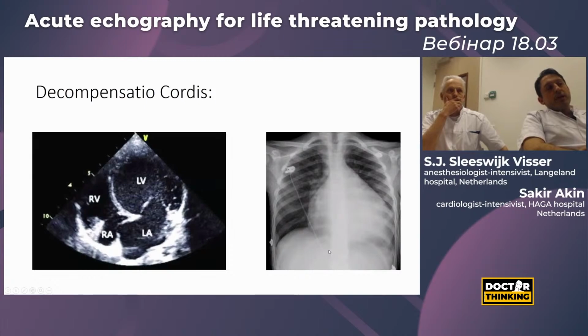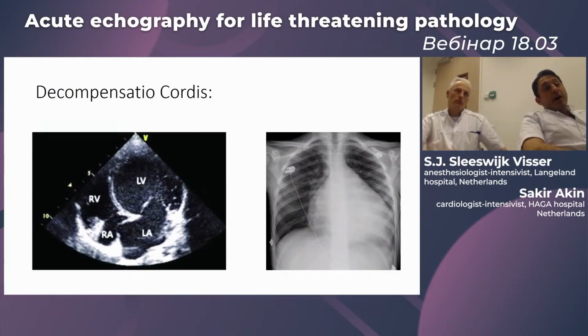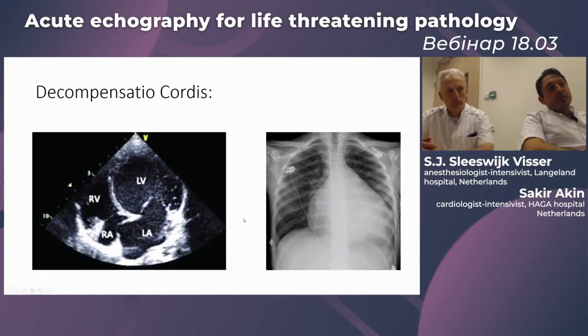And at the end, we also often have patients with acute or chronic failing left ventricle function. Those patients who are known with chronic heart failure can also present themselves as acute on chronic heart failure, which is already shown on the chest X-ray as a big ball in the thorax, and on the echo four-chamber view with a very dilated left ventricle, more than 55 millimeters. And even in moving videos, you can see the spontaneous contrast in the left ventricle with the progression of the decompensation.